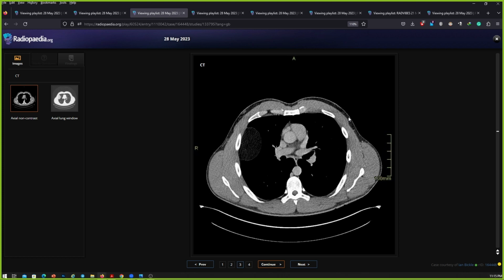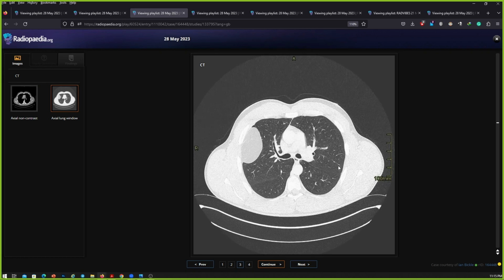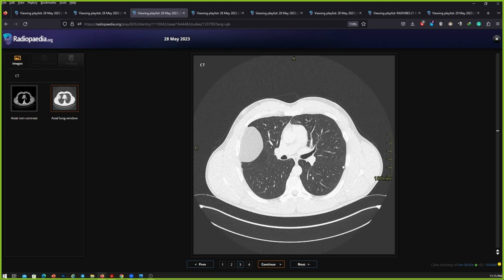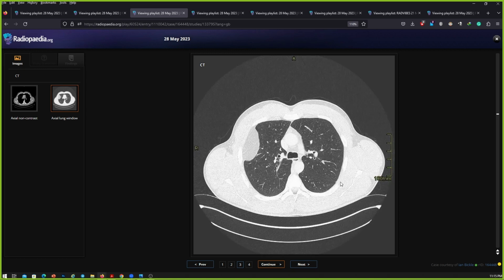So I would like to correlate with the patient's history. If so, the patient has any acute complaints? Okay, we'll stop there. You've done well. As a next step, you would always like to have a look at the lung window to see if there are any underlying changes in the lung due to compression by the mass. Even though this is benign, it is always good to have a look at what's happening in the lungs.